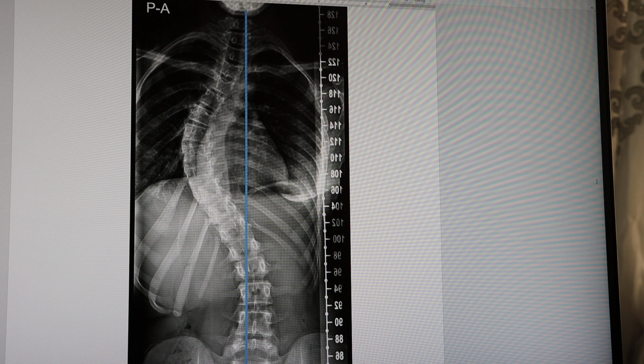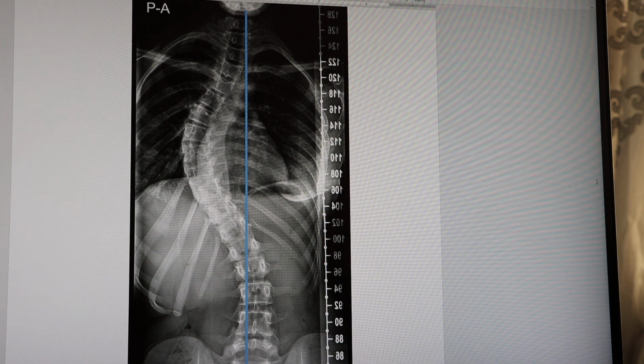So as we said, it's not centered, so there is a side-to-side bending, which is one of the 3 components of scoliosis. So now I can identify that there is an actual curve in the spine. Now this curve is very clear here at the thoracic region.